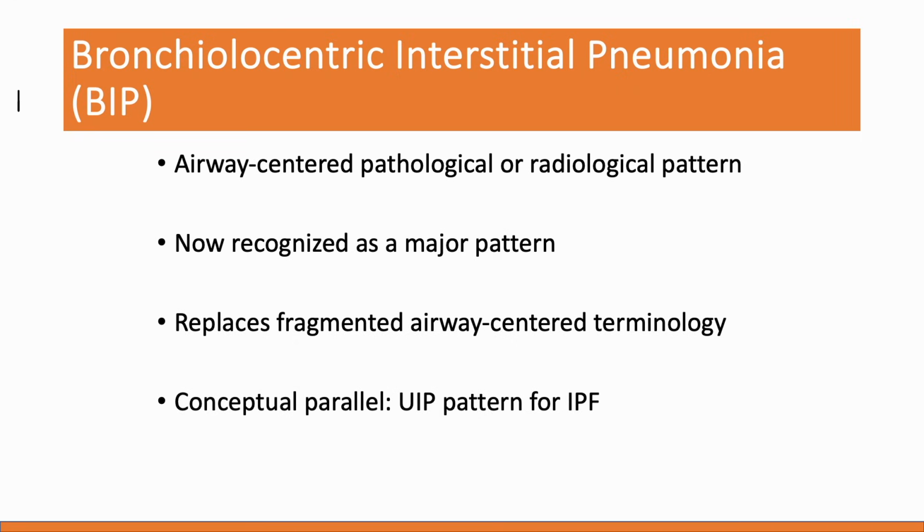Now coming to the latest and the most recent, bronchiolocentric interstitial pneumonia, or BIP. We'll be hearing this more and more often now because it has been recognized as a major interstitial pattern. BIP is a terminology that is being used for airway centered pathology. That is why bronchiolocentric, airway centered pathology and airway centered during imaging. So you should see it around the airways.